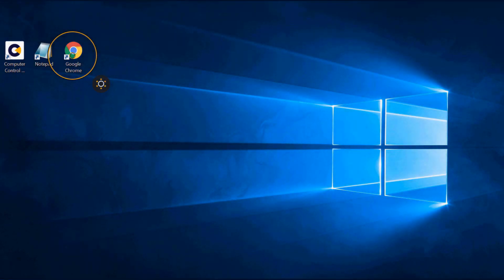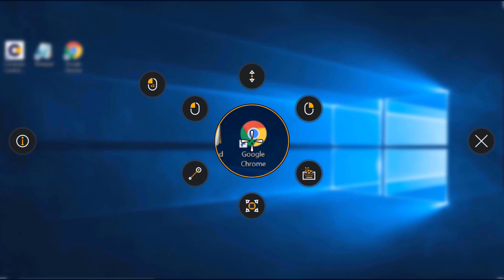When you make a selection on the screen and select the activator icon on the gaze trace, the Interaction menu opens on the center of the screen. Notice that the Interaction menu will always place a magnified image of the selected area and the menu options on the center of the screen. This improves eye tracking success and reduces risks for failure.